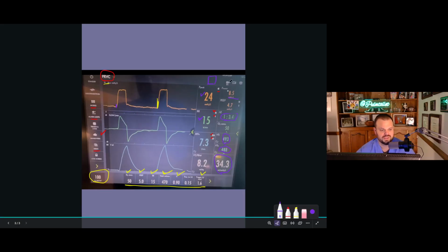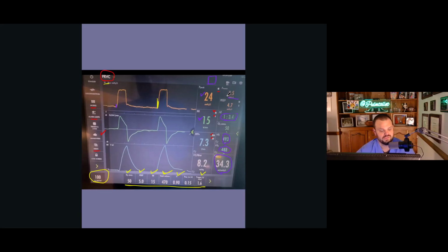The last few things on the vent are up in this top right-hand corner. If you press and hold this button, it'll take a 30-second recording of the ventilator screen, 30 seconds before and then 30 seconds after you push it. Similarly, if you press this button, this is just to capture a screenshot of the vent itself in that time frame. And then here is where you'll store all those images. This might be more useful for respiratory therapy, and I'll tell you specifically how.